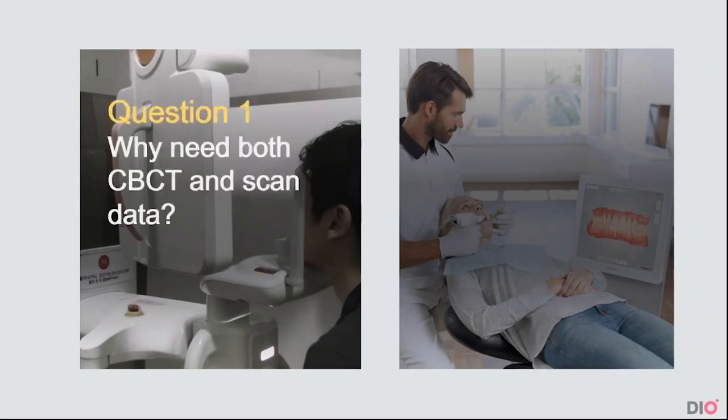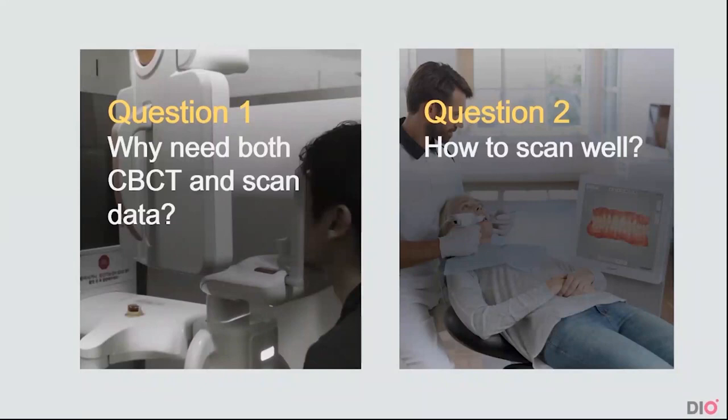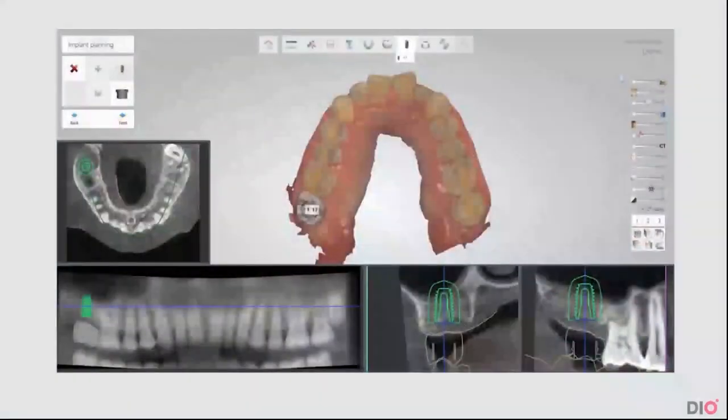Why do you think the digital guide surgery needs both types of data? And if the oral scan data is required, how can we scan well? Today, we are going to learn about these topics. Let's take a look at the DioNavi process.